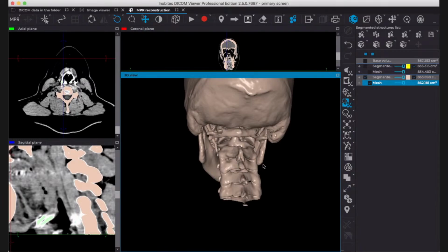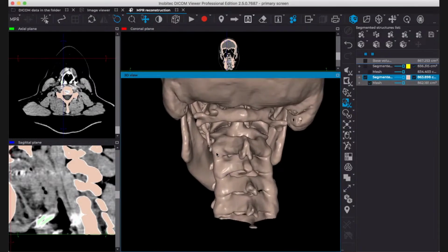Let's say I want to separate this vertebra from the other two, or from the rest of the model. So first, you see here, everything seems to be connected, and that's because all the pixels that are in between these two structures are also high, and then the software considers it's all part of our bone.